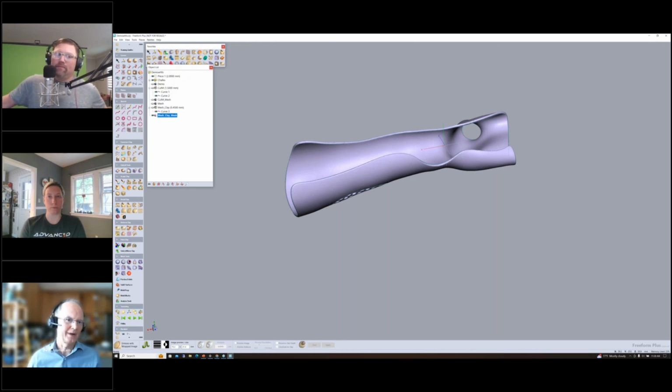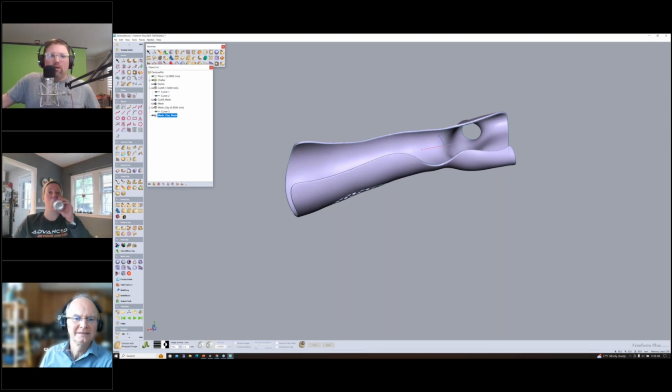And you're happy just jumping between the different formats, voxels to mesh to whatever else you need, curves? Yeah, I think that is one of the interesting things when you're moving between different pieces. You have to know which ones you move between. You can go through and thicken on the clay and all that, but you've got quite a few more steps, which I might add you would want to automate. But this was a very fast way for me to get to where I need to go.